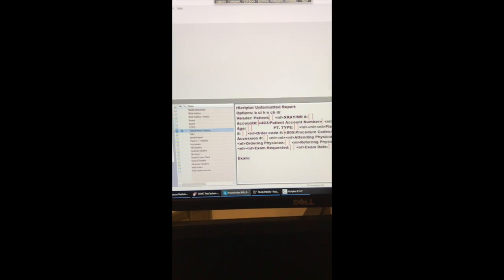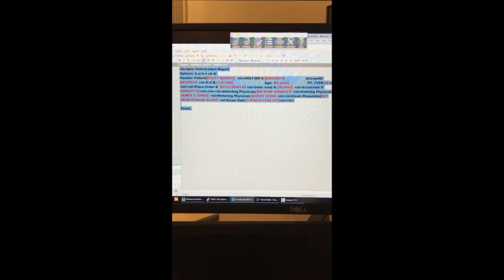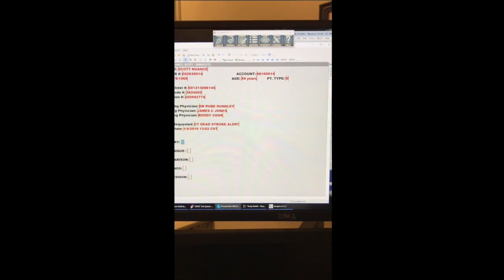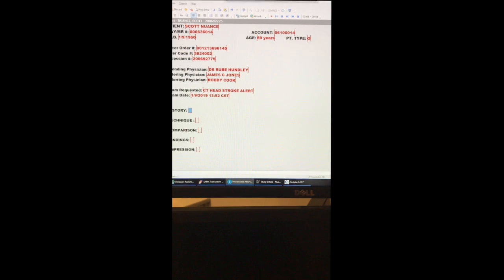If I go back to the dictation window, and let's say I didn't want to use rScriptor, I could just change my default option to the general report template. Click general report, and that gets me this other thing. Like we talked about in the previous email, that gives me a very standard looking report. Then I can just click back and forth in this and dictate like always.